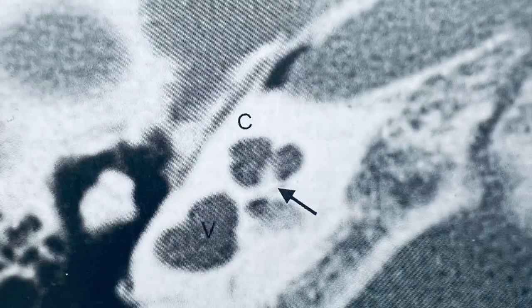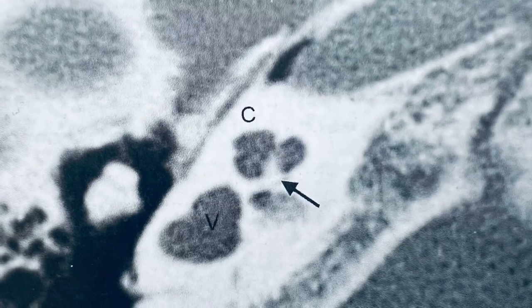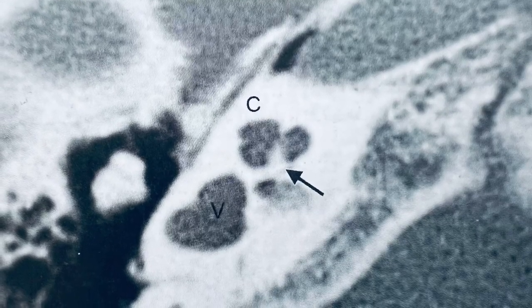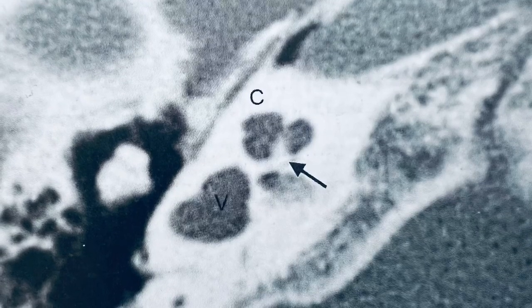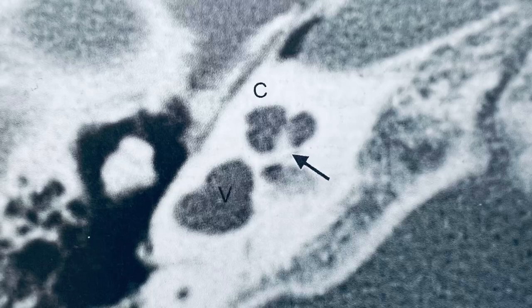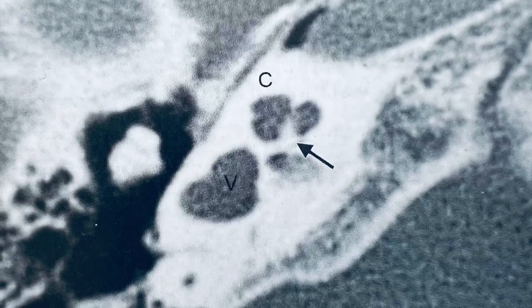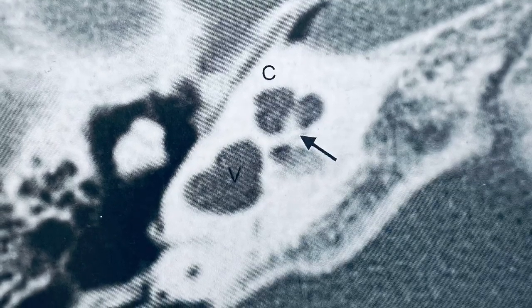This is type 3 cochlear hypoplasia showing less than 2 turns. It has a short modiolus with shortened interscalar septa. The internal and external architecture is similar to a normal cochlea. In some cases of type 3, the cochlear aperture is also aplastic, as you can see in this black arrow, with some having a hypoplastic or aplastic vestibule and semicircular canals.